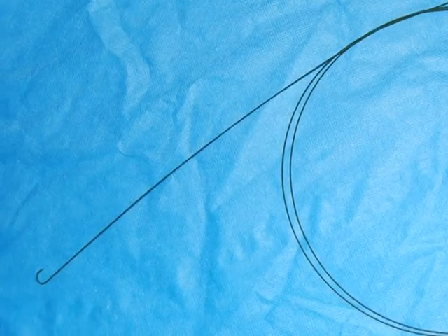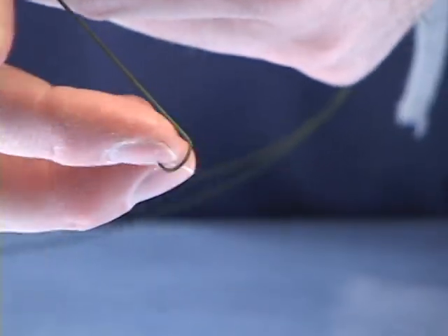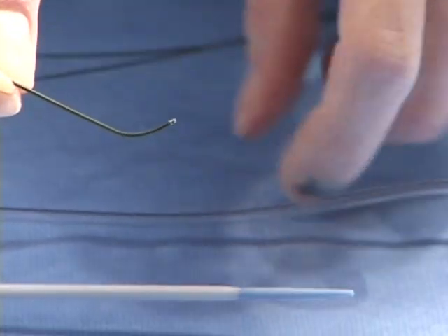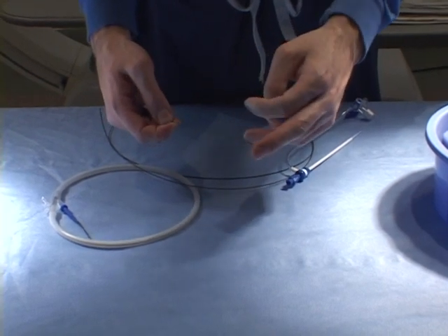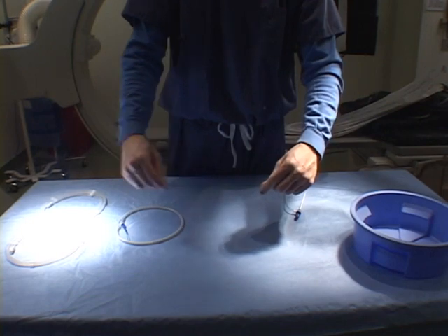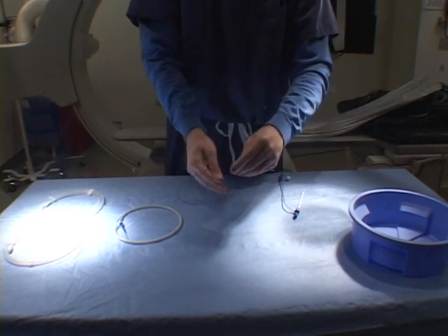The most common guide wire used is a .038 flexible J-tipped guide wire in a 180 centimeter length. These guide wires come in 0.035, 0.022, and even fine angioplasty type guide wires in 0.018 inches. They are flexible at the tip, which enters the body, and stiff at the other end. Exchange guide wires come in 300 centimeter lengths, which permits the operator to position the guide wire in the distal part of the heart or arteries and then exchange for different catheters.